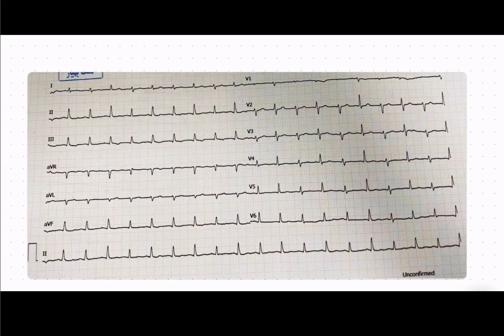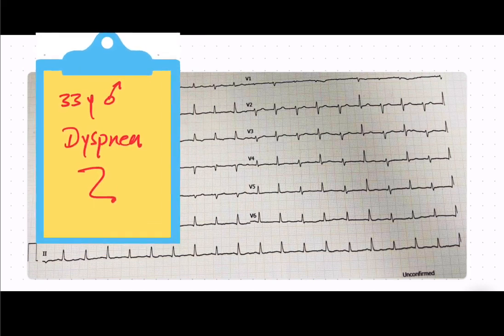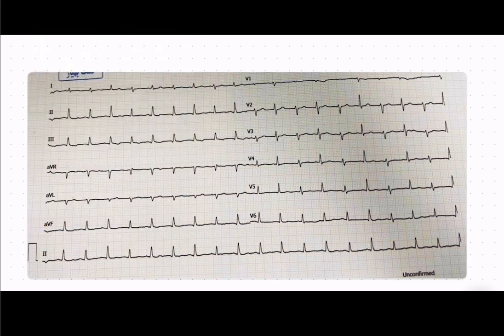Today, I'll be sharing an interesting case of a 33 years old man presented to the emergency room complaining of dyspnea. You can see 12-lead ECG. I suggest you pause the video and have a look at the ECG. After a moment, I'll provide you with an in-depth breakdown of what we are seeing.